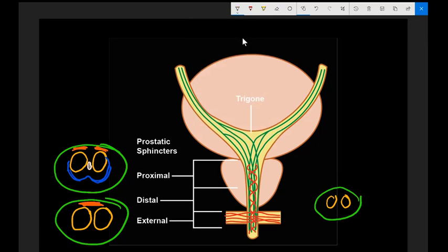I didn't bother to put it over here. I probably should have. Here's your urethra again. We've got some periurethral tissue around it, and you'll be able to separate those out by their signal intensity on MRI, and then everything else down low is going to be PZ. So there's no central zone down here, and the anterior fibromuscular stroma is once again going to bleed together in a kind of a short, stubby little flat structure here anteriorly.